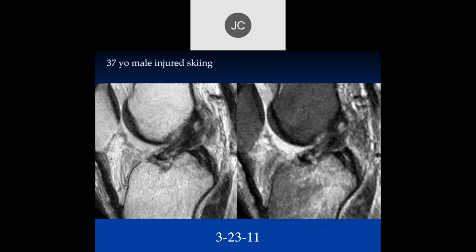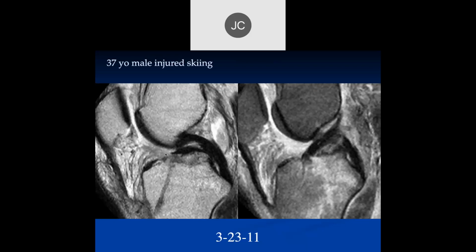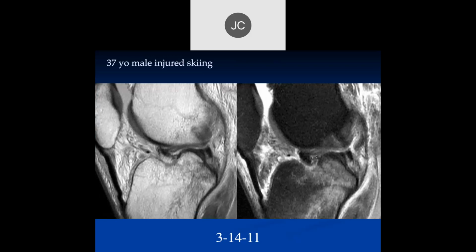It looks to me like there's a bunch of fibrous tissue within that. Okay, well, this image, it looks like it's kind of tacked down. Right. So it looks like it's well healed. I would say. So this is the acute injury. We have a displaced fragment in this patient, this is also an adult. This is this fragment on 3/14.